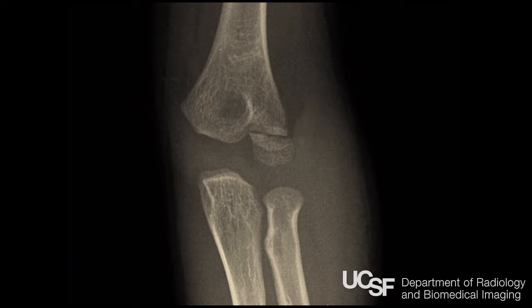This is a horribly photoshopped series of images, because I don't have them all, but it illustrates the point. There are a lot of things that can happen in the pediatric elbow. Using our numbering system, 1, 7, 10, 11, this child is not old enough to have 7, 10, or 11. They only have the capitellum. So the radius is lined up with the capitellum, the radius is lined up with the ulna, the capitellum is lined up with the humerus, and the capitellum is lined up with the radius and ulna. So everything's lined up on this image.